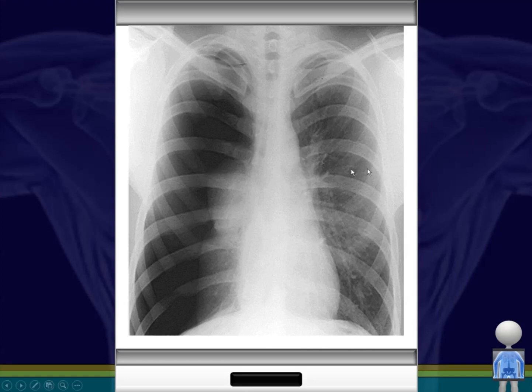So we see on the left side here is normal, okay? So this left side is normal. You see all these normal markings. This is a very normal look to a lung. You'd expect this. There's nothing wrong here. But what's wrong here is that there's nothing here. This is this dark appearance of air, and this is the lung collapsed after a pneumothorax. Okay, this is the lung collapsed after pneumothorax. So this is a pretty obvious one.